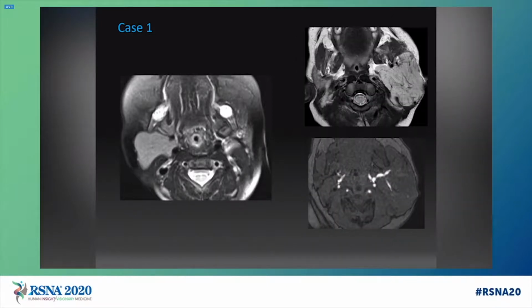Could it be a hemangioma? Well, hemangiomas are true neoplasms, and they are high flow lesions, meaning there tends to be arteries inside, so we can see flow voids on an MR. Our index case here has absolutely no flow voids within. Here's an example of a hemangioma with flow voids. They tend to enhance very avidly, and on an MRA, you can even see some of these feeder arteries. So this does not look good for a hemangioma.